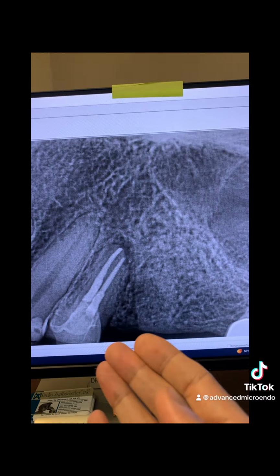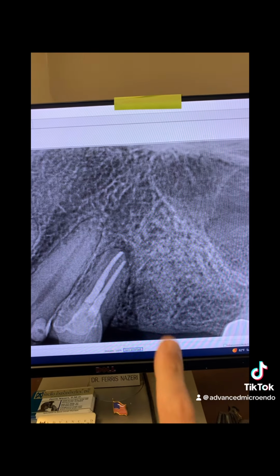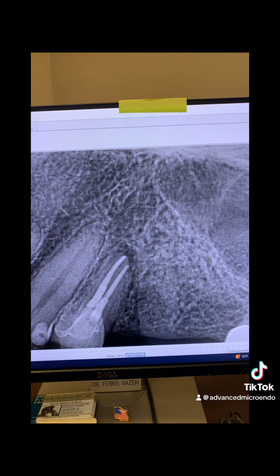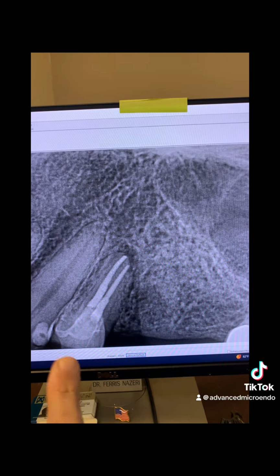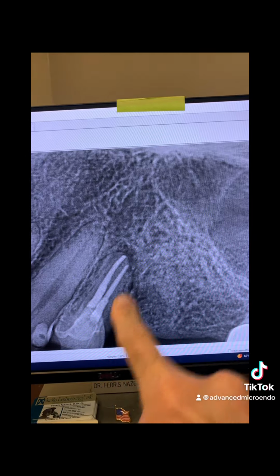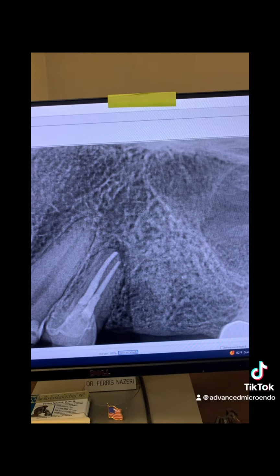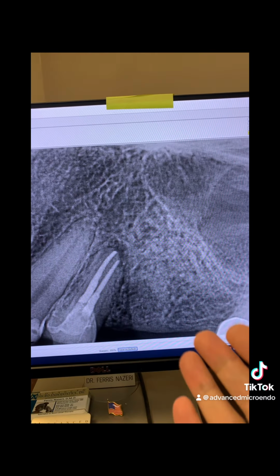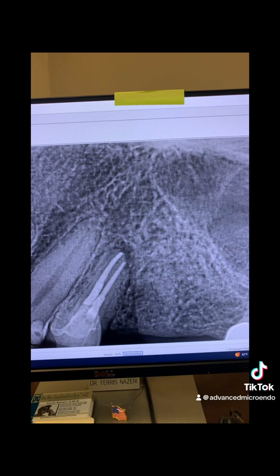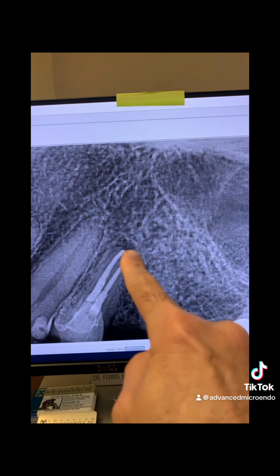So the dentist saw this on the x-ray and wanted us to check and see what's going on. So you can see there's a crown on the tooth, percussion, palpation all within normal limits, probings 1 to 2 millimeters all around, and as you can see there's a previous root canal, and it looks like a periapical lucency there. So just because I'm an endodontist doesn't mean I'll redo this root canal right away just because I see this.